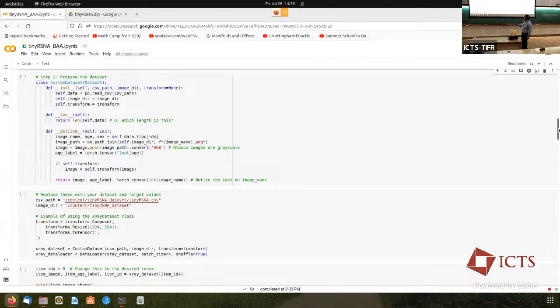Okay, and then I have transforms.ToTensor. This ToTensor is important because, okay, I can resize it, but what is it? It's some sort of image, and different packages can have different representations of the image. So I need to transform it to a PyTorch format using this ToTensor. This ToTensor is something you have to look out for.